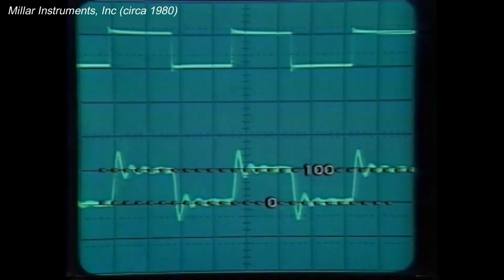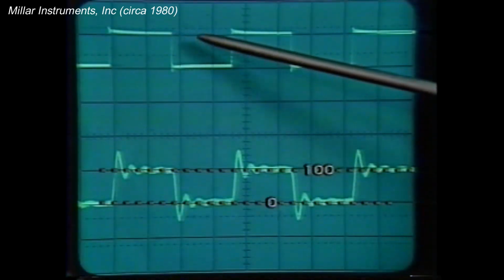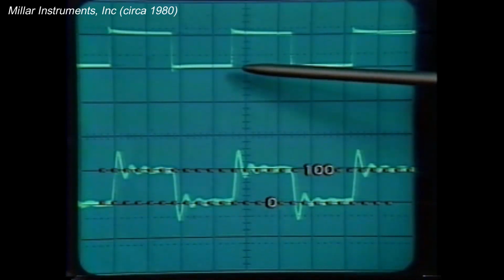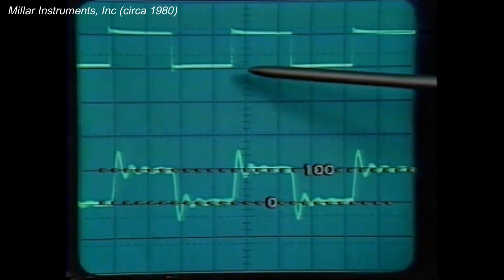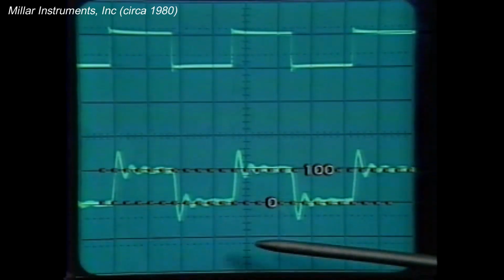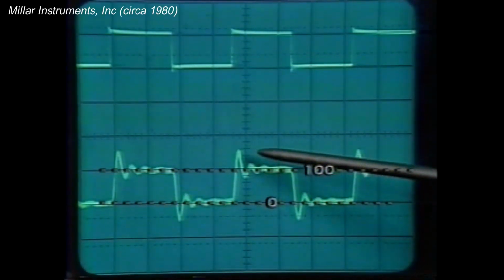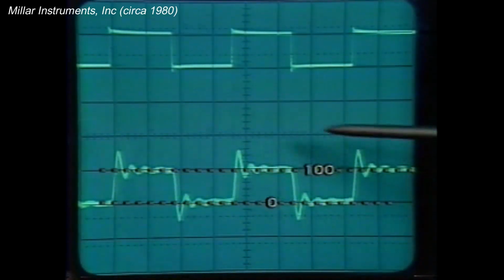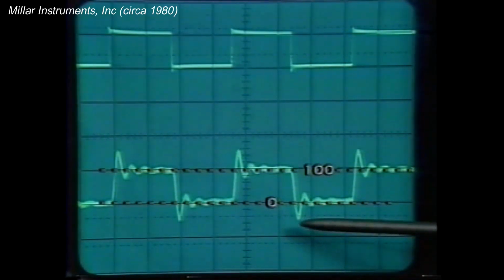In order to quantify what these distortions might mean in the interpretation of a patient's blood pressure, let us assume that systolic pressure, located on the top portion of the high-fidelity waveform, is at 100 millimeters of mercury, and the bottom of the tracing, or diastolic pressure, is at 0 millimeters of mercury. However, on the lower waveform, at the same calibration, the patient appears to have a systolic blood pressure of 150 millimeters of mercury instead of 100. And his diastolic pressure indicates a peak negative value of minus 50 millimeters of mercury.